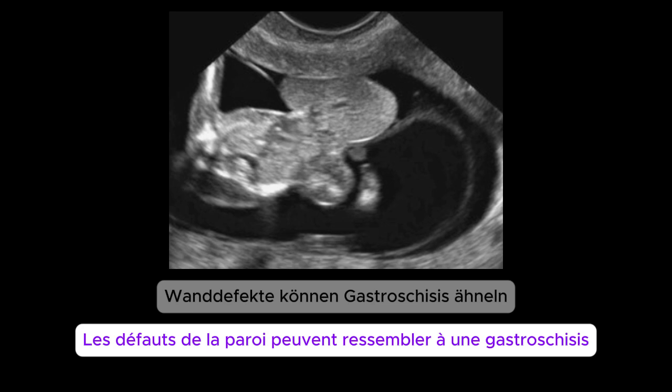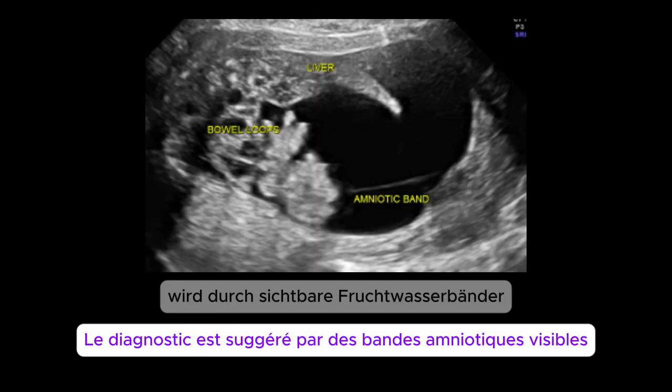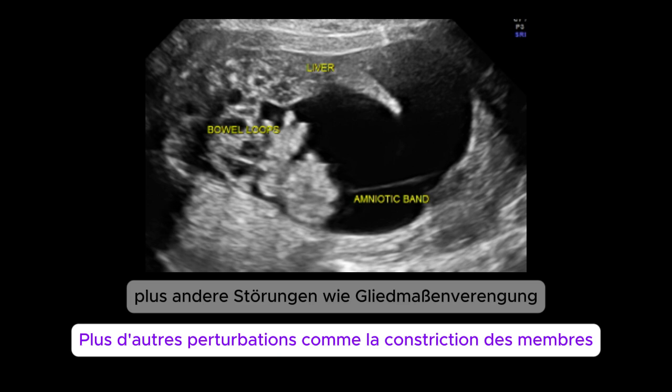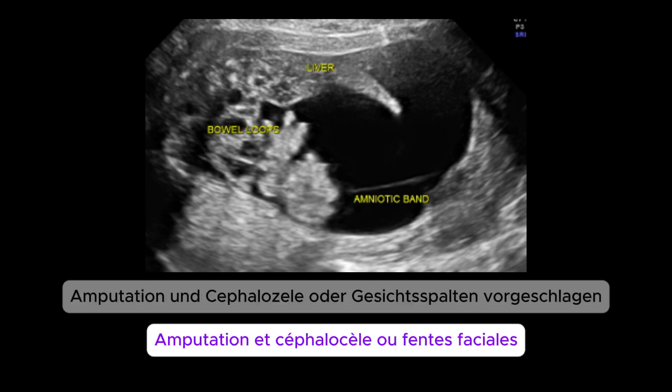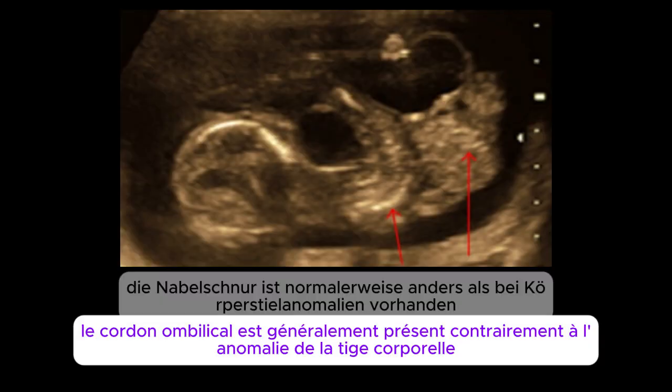Wall defects may resemble gastroschisis, with organs floating freely in the amniotic fluid and no surrounding sac. Diagnosis is suggested by visible amniotic bands, plus other disruptions like limb constriction, amputation, encephalocele, or facial clefts. The umbilical cord is usually present, unlike in body stalk anomaly.